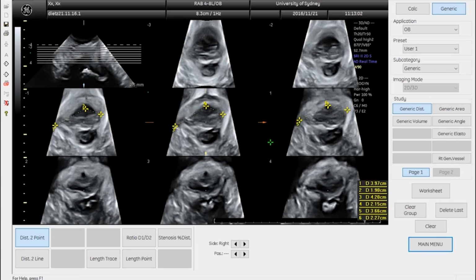So this is a full right-sided avulsion, and it is defined by the minimal criteria of at least the 3 central slices all being abnormal on one side. In this lady, clearly the abnormality extends much further, but that's not necessary for the diagnosis.